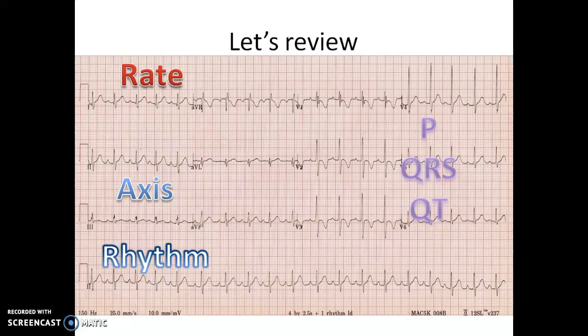And we know how to measure it. Yeah, Bazett's formula. Good. Okay. And next, the T wave. Right. So as you can see in neonatal, in newborn, first few days as a newborn, what happens to the T wave? It's upright. Yeah, that's correct.